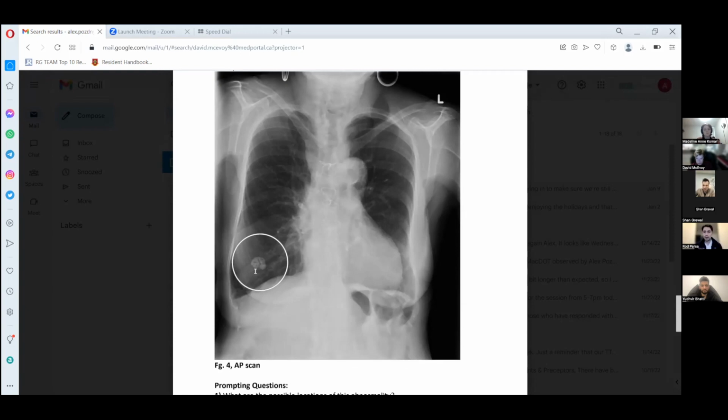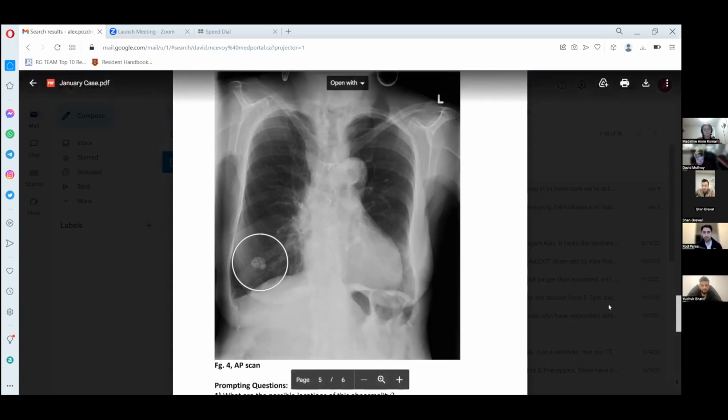Got it. Just a follow-up question: for a study like this where the abnormality is kind of obvious, to what extent do you still go through your checklist and comment on other things that you might see? Yeah, for sure, that's a great question. In the early stages, I would definitely go through all of the checklist.